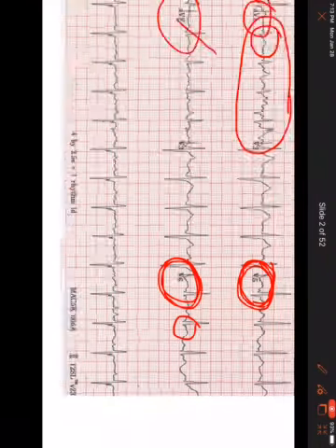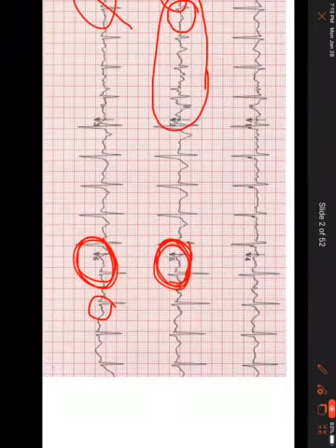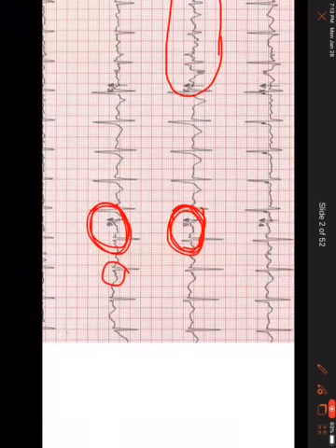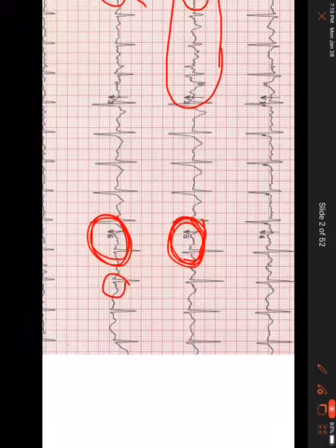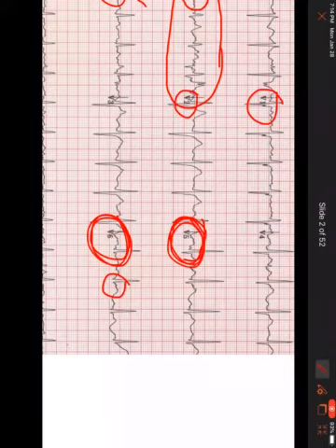Okay. So now let's go back to our precordial leads. So we have our septal leads, which is V1 and V2. Okay. Now these give us a pretty good look at what's going on with the 12 lead. So V1, let's identify a good ST segment or J point.